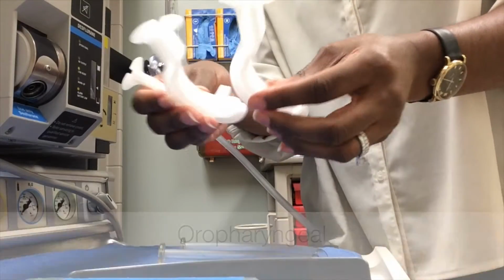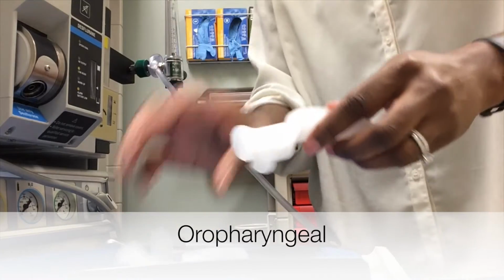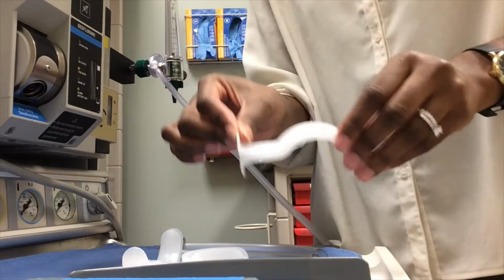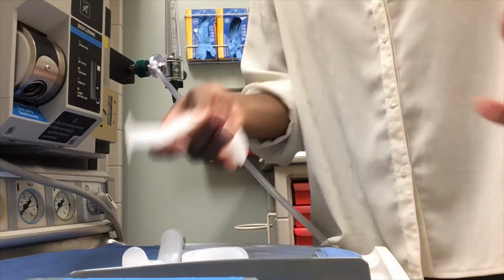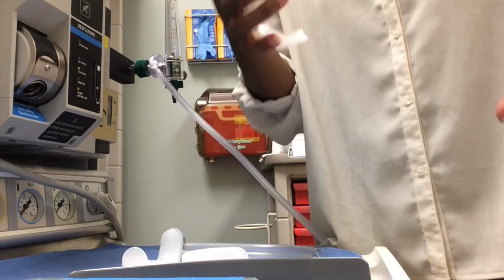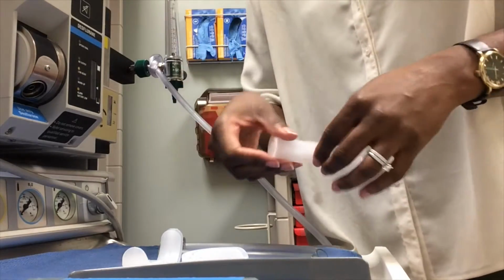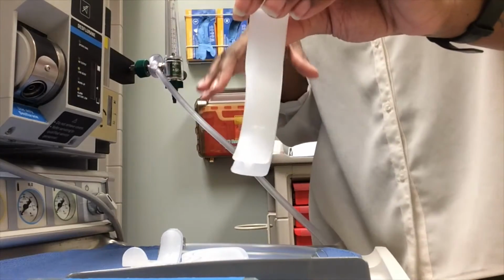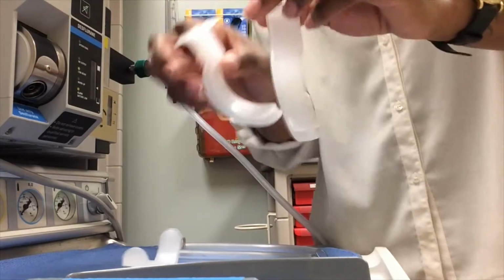These oropharyngeal airways go into the mouth and kind of move the tongue out of the way. A lot of times you use this right after you give something, say like fentanyl, that causes respiratory depression. And before you ever paralyze someone, you want to make sure that you can ventilate them and bag them with the mask. And it kind of depresses the tongue and opens up the airway a little bit more. So there's always different sizes.